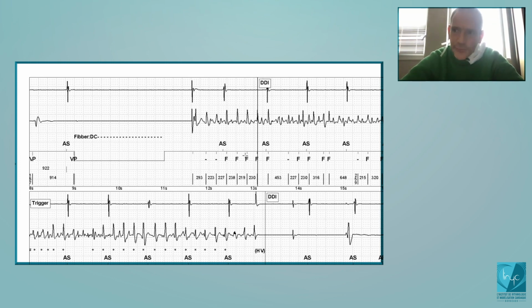Therefore, even if there is undersensing, I want my device to correctly detect an episode of ventricular fibrillation and deliver a shock. And that's the reason why they have chosen this way of classifying the cycles, to avoid the risk of non-therapy in case of undersensing during ventricular fibrillation.